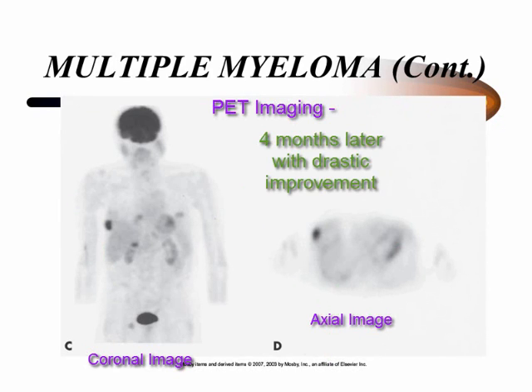After 4 months, when the patient is in his last cycle of chemotherapy, the survey images shown here demonstrate persistent, viable, metabolically active neoplasm. However, a drastic improvement in the overall pattern in comparison with the earlier scan is seen.